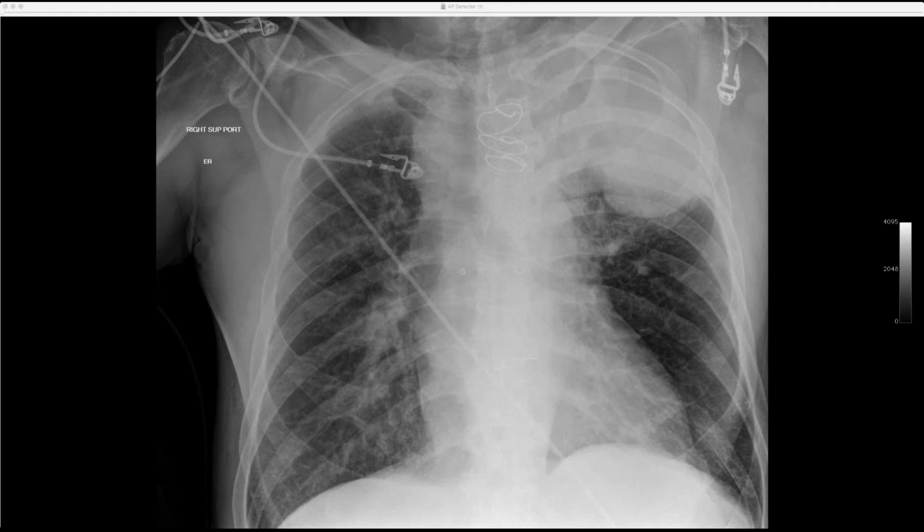Okay, well, here's another vascular case. This is an older man, I forget how old he is, I want to say in his 80s, who was transferred after a trauma, a motor vehicle crash, and had this interesting radiograph.